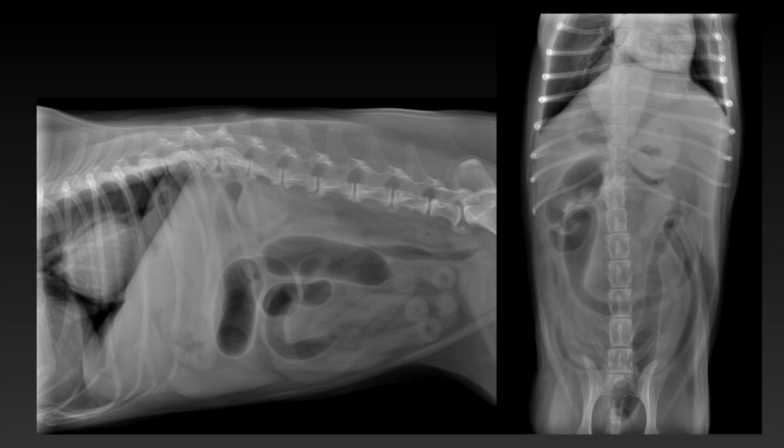So my conclusions for the radiographs are a segmental dilation of a small intestinal loop with questionable foreign material, a sliding hiatal hernia, an empty colon with signs of hyperperistalsis, a thoracolumbar transitional vertebra, and a chronic intervertebral disc disease at the level of T12 to L1.